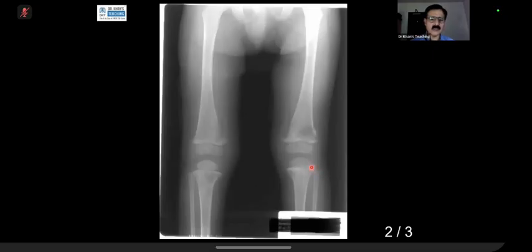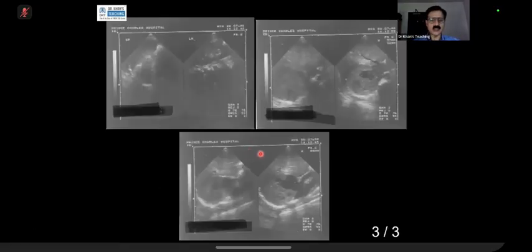Even in lead poisoning, they will show you a lead poisoning case where the dense metaphyseal band will also involve the fibula. The physiological ones don't involve it, because there is no weight bearing there. So it is good that we have gone into a different topic, but otherwise the main finding here is that there is a lytic lesion, erosion, maybe a developing erosion here. This is a classical case of mets from neuroblastoma and a classical exam presentation. And you can see this is superior to that.